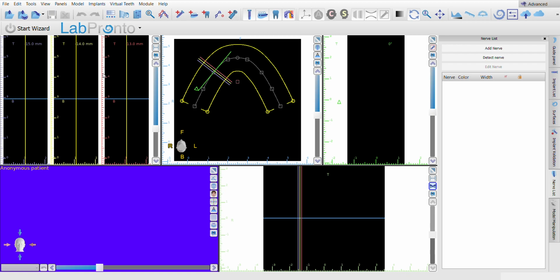This happened to be on my desktop, so here I changed the patient's name to Pat, and these are all your DICOM images. There are like 400 or 500 images per case, mandible and maxilla.